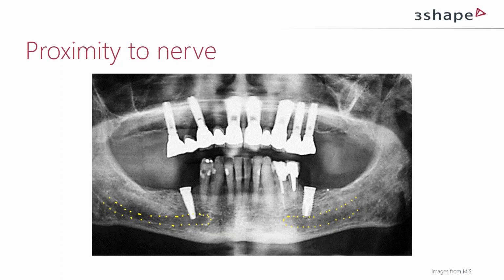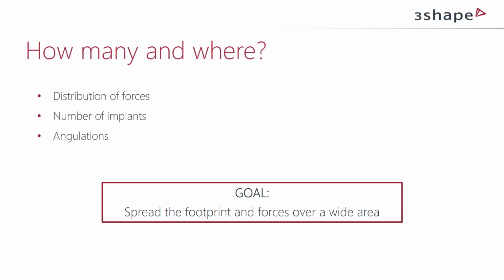So we have one part left, and it's actually how we should place the implants for the best power absorption, how to place them to be able to receive and work with all the forces that we get from the teeth when we are eating.